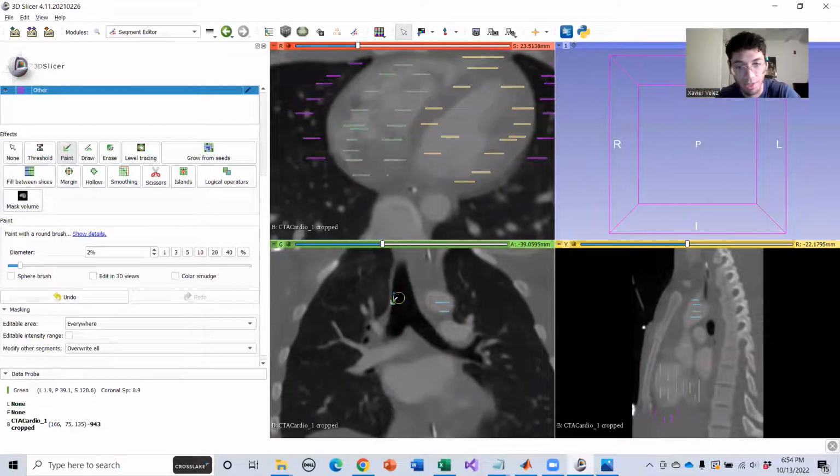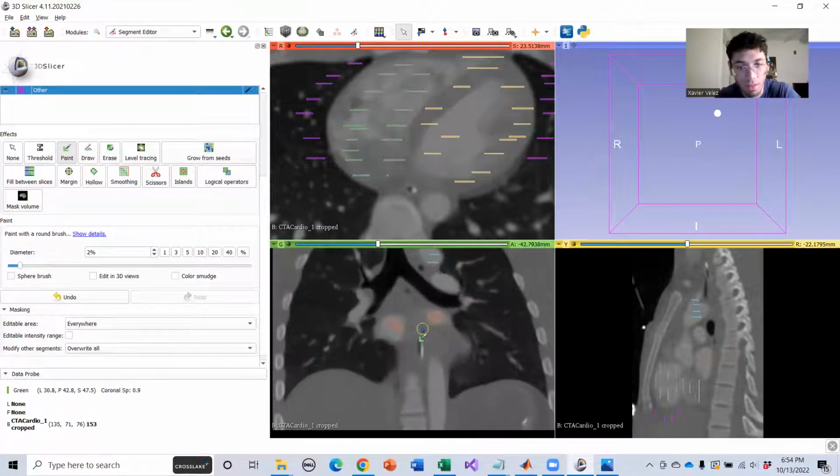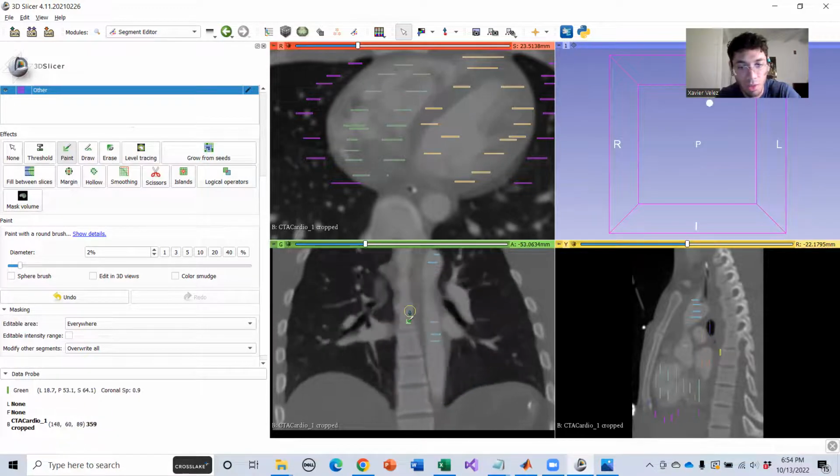Okay, I'm not even going to touch that stuff up there. Sure, we'll do one more here and then we'll do the ending. So we'll go all the way through there. Nice. And then we're going to strike through the spine, right? Because we don't want that.